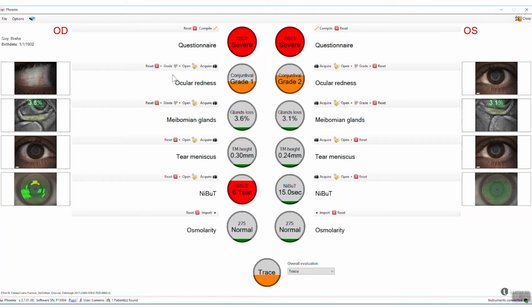What we are doing now is we've completed the report, but why don't we have a look if we're going to use this report as the starting point and not as the end point.